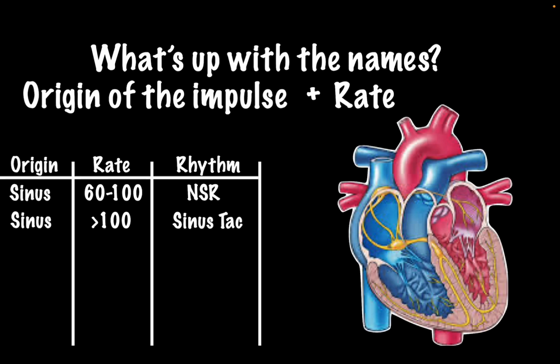Now I'm going to pause on this next one because I want you to try to do it yourself. We have another impulse originating in the sinus node. This time the rate is less than 60. Go ahead. You got it. Sinus bradycardia. Now let's go back to EKGs and see what these look like on the cardiac monitor.